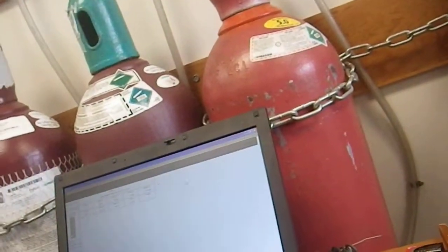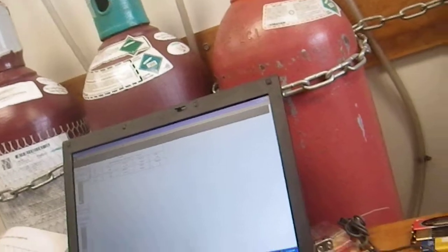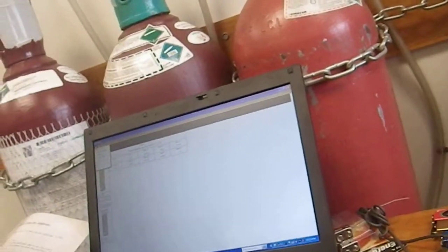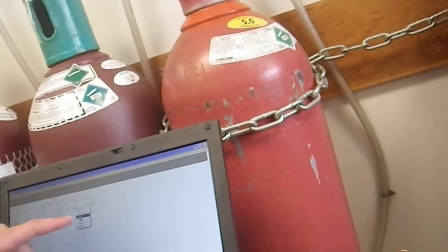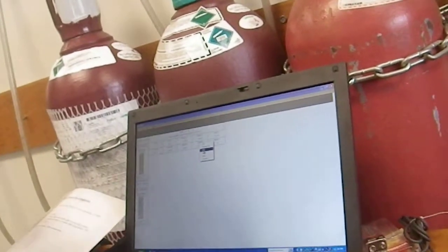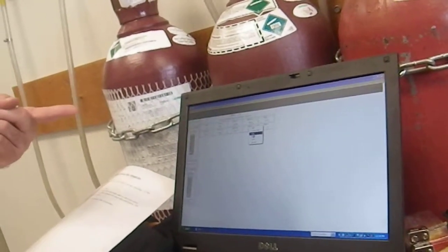Wait, which one close? How do I close? So just file. You hit close. And then you hit playback again, repeat. If you want to do another file, playback, select your next one. Then from here, log is going to be selected still from your previous one. So deselect it, go back, select it again, and then you'll have your new output file. Otherwise, it'll overwrite the other one.